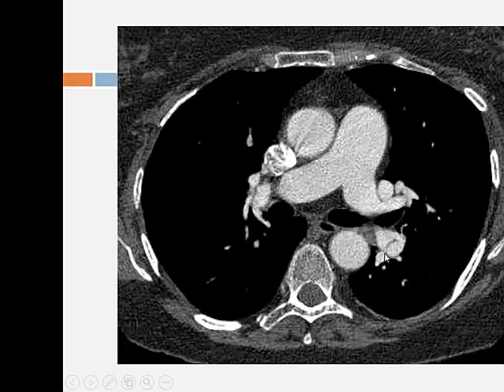This is an example of a web in the vessel. So what you're doing is you're looking for these straight lines. You sometimes see an abrupt caliber change as well. And obviously, you can sometimes see a complete vessel cut off.